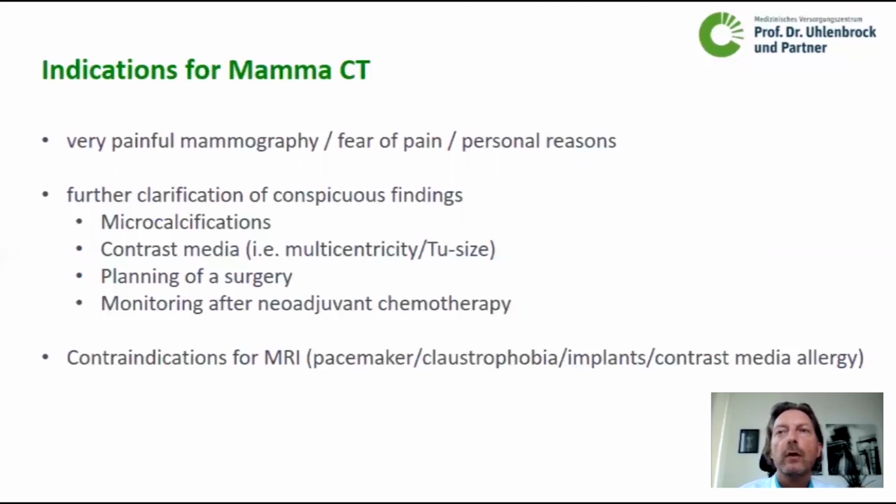You can use it for planning of a surgery and for sure for monitoring after neoadjuvant chemotherapy. Lastly, it is suitable for patients who have contraindications for going into the MRI, like a pacemaker or claustrophobia, or maybe they have implants or an allergic reaction against contrast media, which is used in MRI.